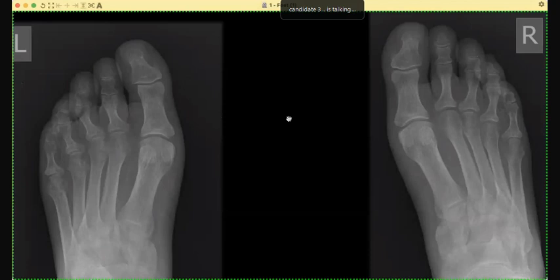Okay. I'm presented with X-ray of both feet of an adult female complaining of chronic foot pain, and I see that there is a bilateral metatarsophalangeal joint pathological process in the form of periarticular erosion and cortical irregularity, with no intra-articular affection. I wonder if this patient has gouty arthritis.